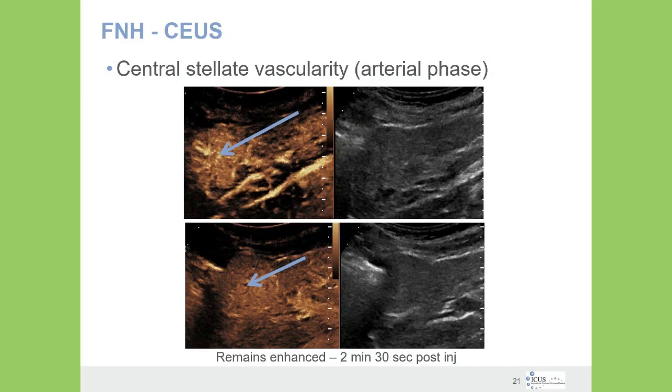I don't know how many sonographers can say with confidence that they have imaged an FNH without contrast ultrasound. This becomes very easily distinguishable with contrast, though. This patient has a subtle liver lesion. If you look at the grayscale image, you can see a slight contour difference in this case, but it is slight. So pretty subtle image that was seen on a CT urogram.